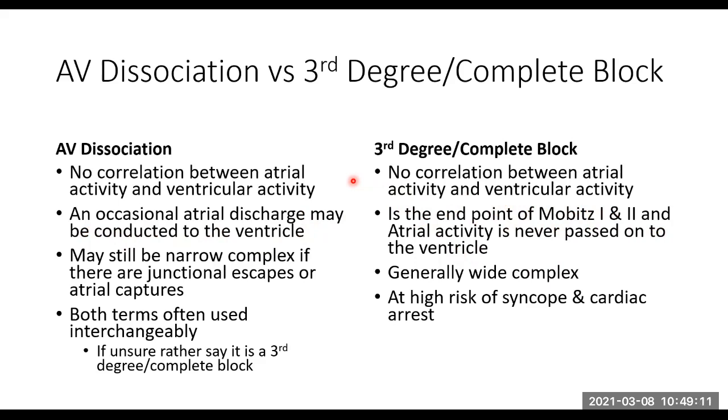If you go to a cardiologist, they'll give you this old machine. Some of you guys may know what cassette tapes are, giving away my age, but they still have these things amazingly. At least recently when I took a family member, they still gave her that. It's a machine that does a 24-hour ECG rhythm check, and it records it on a cassette tape. And basically what it does is it looks for these occasional P waves that are connected to ventricular impulses. So you have this P wave with a narrow QRS complex.